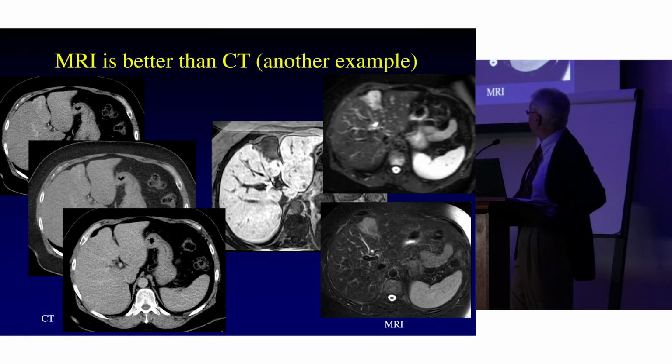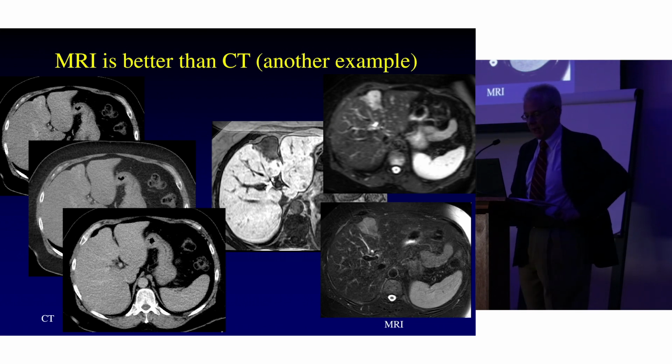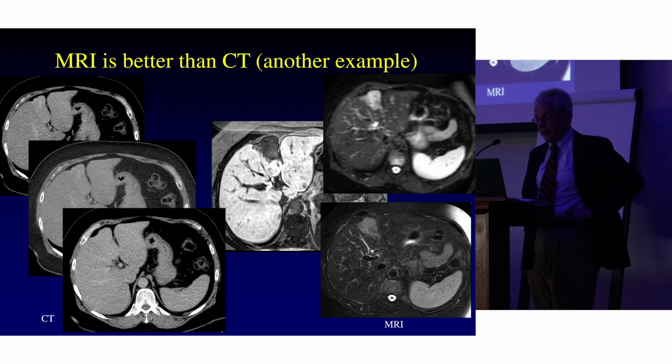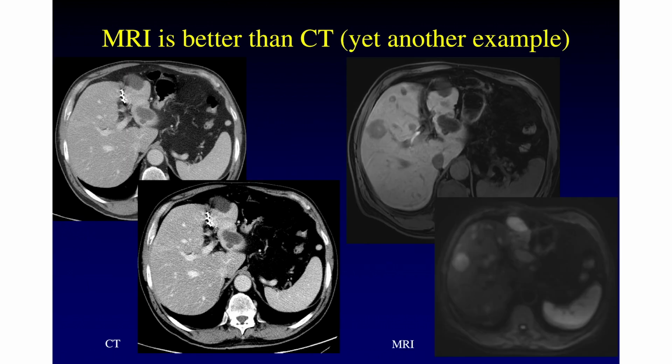As another example, and unfortunately, this one is projecting too white compared to how I have it on the slide, but this is a good quality CT, different phases of the imaging, and maybe you can start saying, well, maybe there's something funky going on there, but clearly on MRI, you can see that tumor, along with other little white dots in here, and you're really not seeing anything on the CT scan.